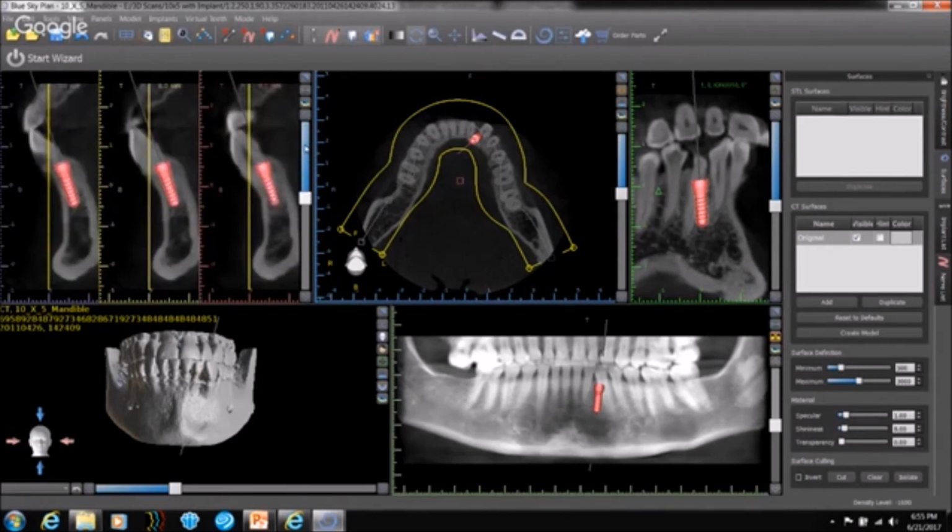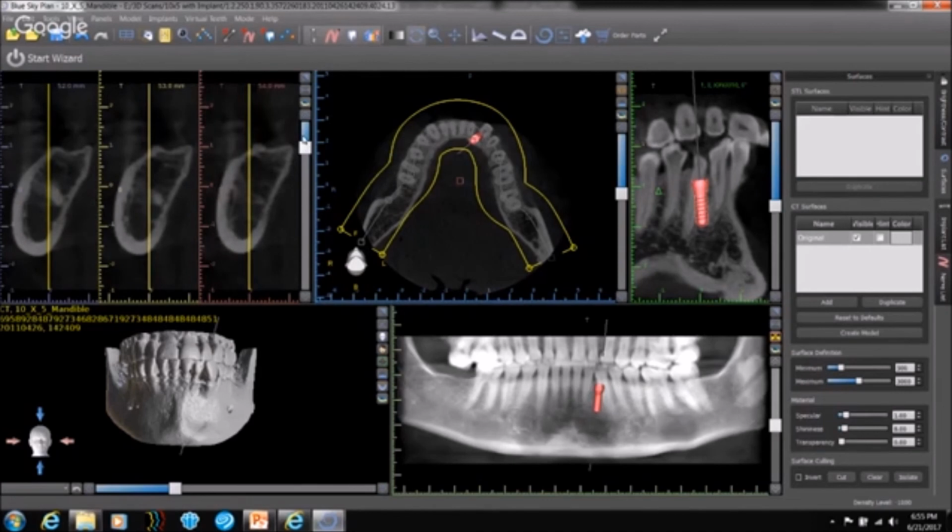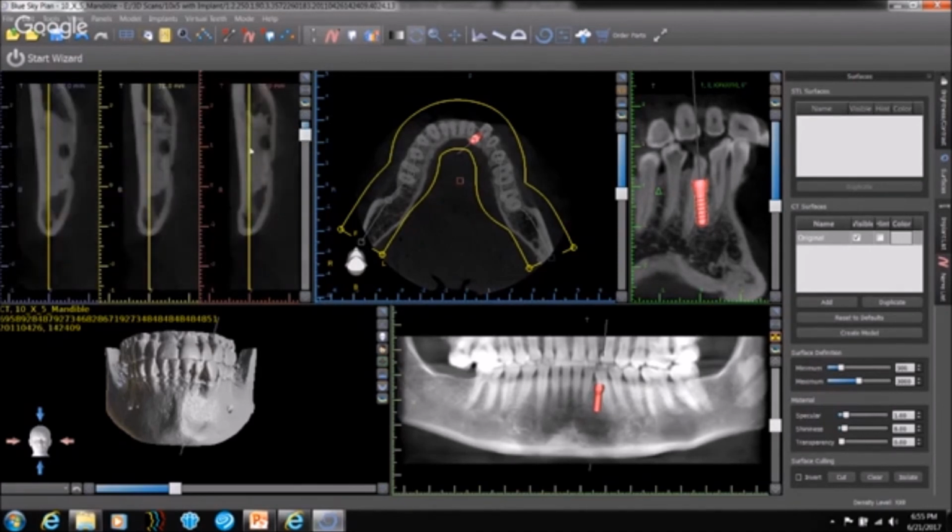So what you see over there is just dense bone. This is actually a textbook case to show that the internal structure of the bone could vary even from one side of the jaw to another side of the jaw. So it is nothing but a dense bony island. In this case, there's no expansion. It just seems very localized and does not affect the patient.